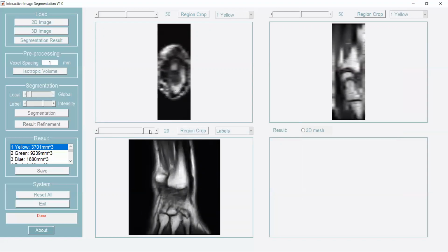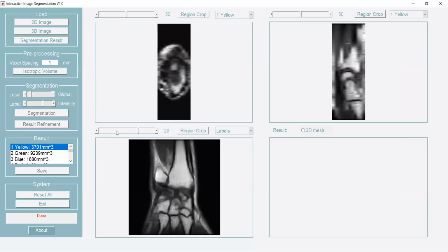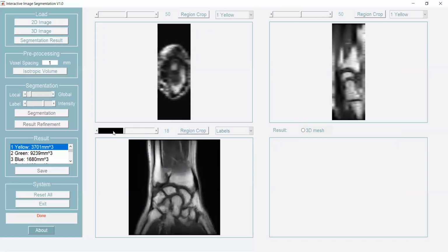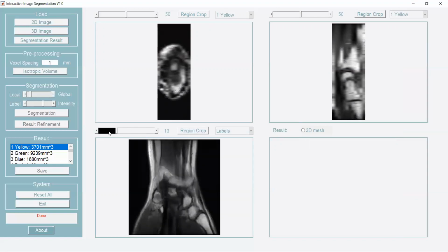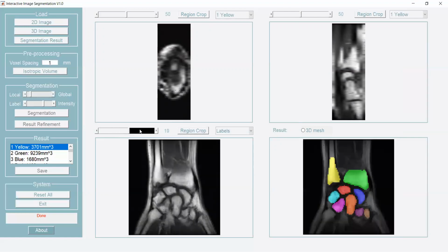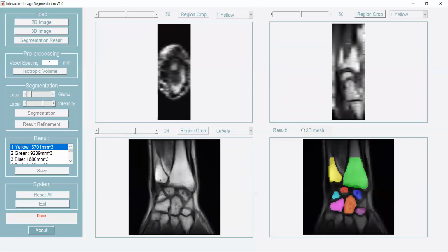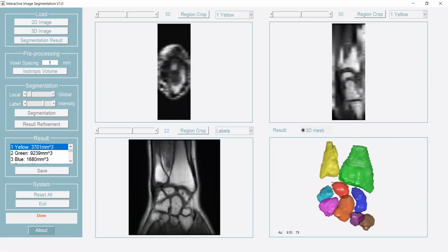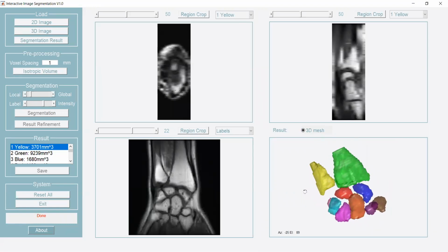And I don't believe other software can do a decent job. By simply clicking points for 10 different classes, you can easily get lost when you go to different slices and you don't know which bone belongs to which bone. You can easily get confused. But with our software, you can easily get this information and interactively improve it by adding labels to different slices and removing the wrong labels. And also you can see in 3D how it looks in 3D. But it's pretty low resolution.